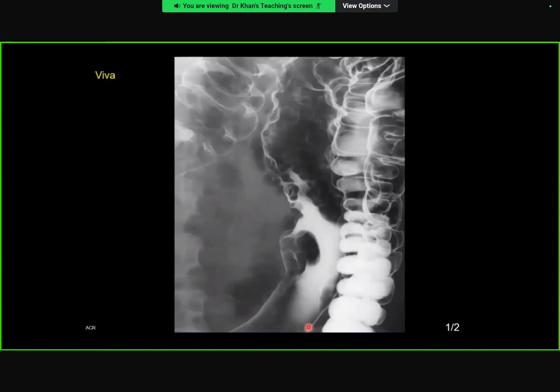The rest of the bowel is of normal caliber. So there isn't a halo sign as such, or a target sign, to suggest there's an ulcer there. And I'm thinking whether these are multiple polyps. And it's an Aunt Minnie case.